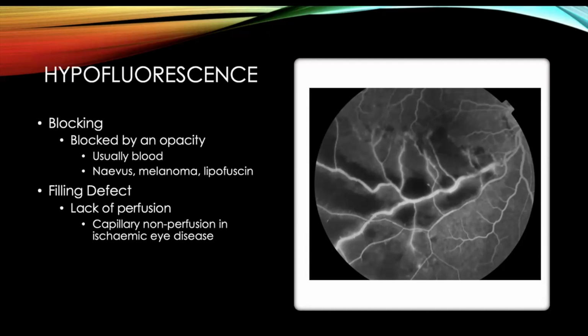So when you're looking at something like a CRVO or a BRVO, these changes will make you slightly more concerned that the patient is more ischemic, they have a higher ischemic drive, they're more likely to get lots of VEGF being pushed through, so they're more likely to get complications of those retinal vein occlusions, like new vessels, for example, and rubeosis.